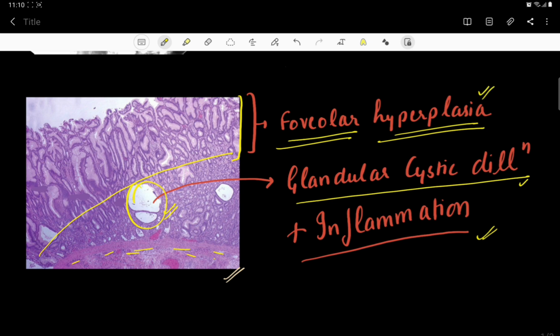Well, in the biopsy, along with this foveolar hyperplasia, there is one more thing that is seen. There is this thing called parallelism of the glands. Like as you can see, these glands are arranged more parallelly to each other. This is quite characteristic for this disease. And this also happens due to this foveolar hyperplasia.